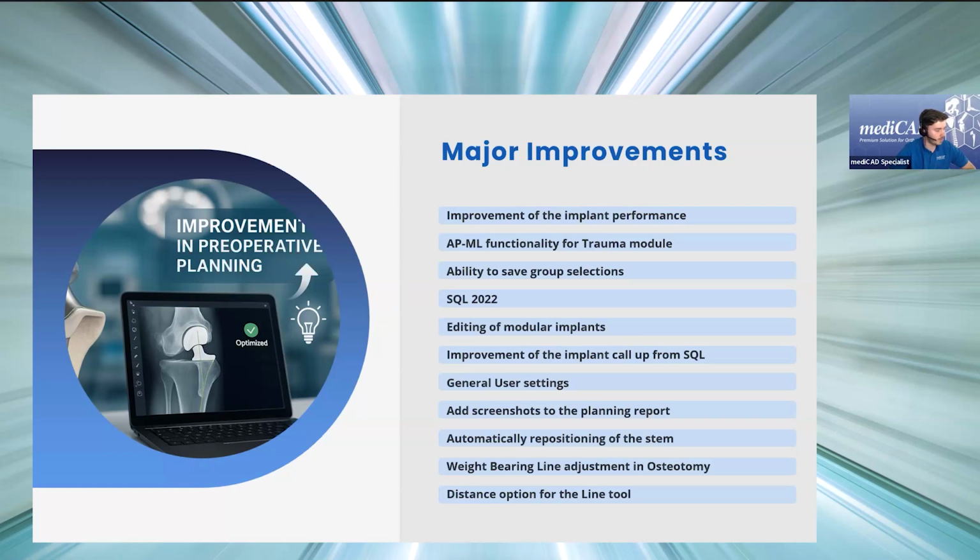So this is actually one of the bigger updates we did in the 7.0 cycle. A lot of minor improvements or minor feedback was included that we got over the time of this upgrade, and then also some technological updates, which I also will go over in the beginning real quick.